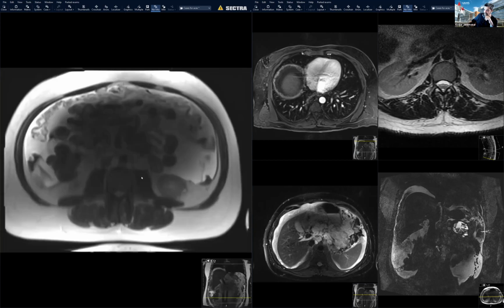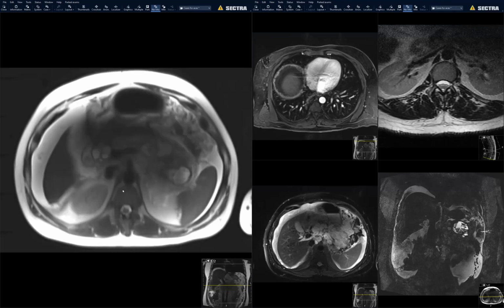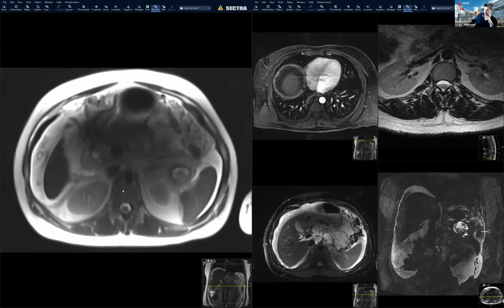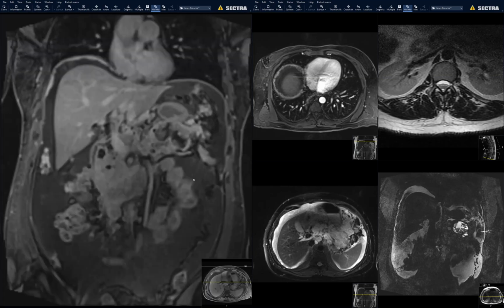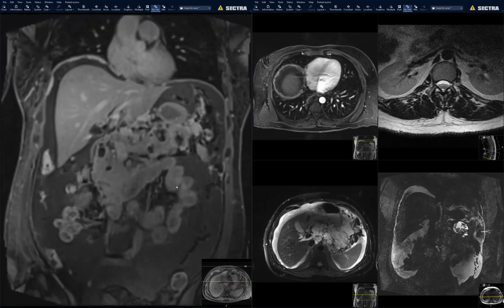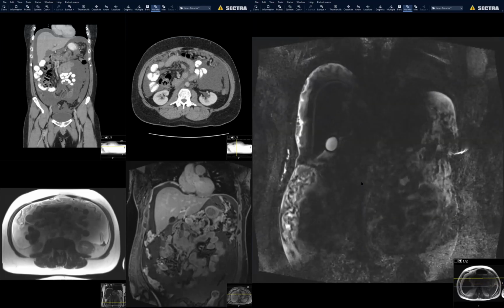So then he had an MR. And of course, he had ascites. And he had an FNA, so I can tell you what that turned out to be later. So this is the axial. Anyone else have any thoughts? This is the coronal. To me, it still looks very like papillary fronds within cystic structures. So I'm still thinking maybe some variant of an IPMN with very extensive polypoid growth.